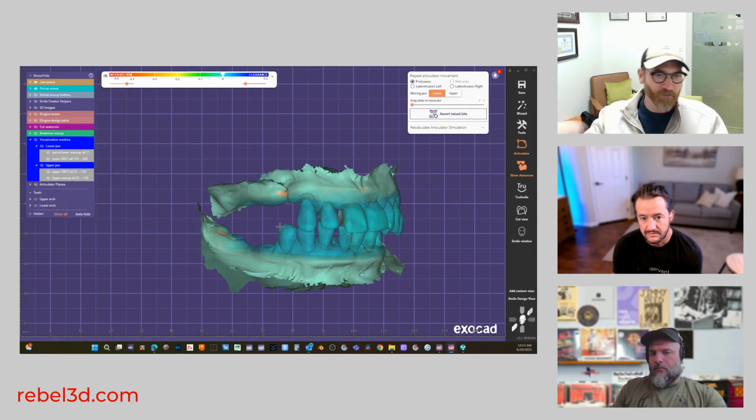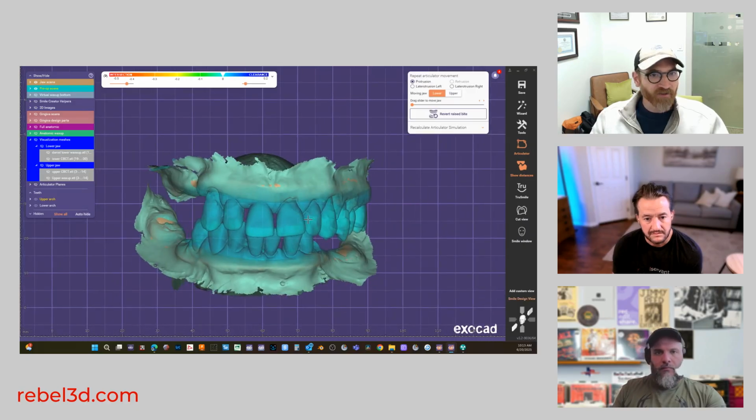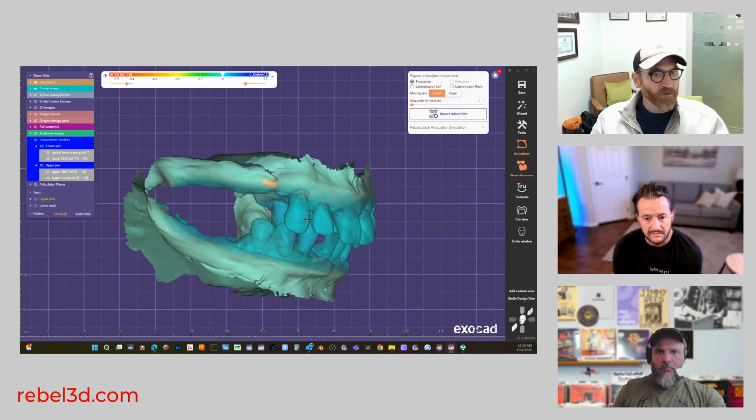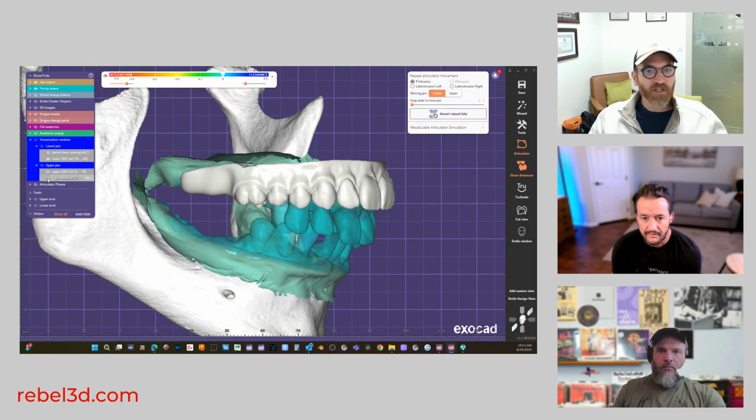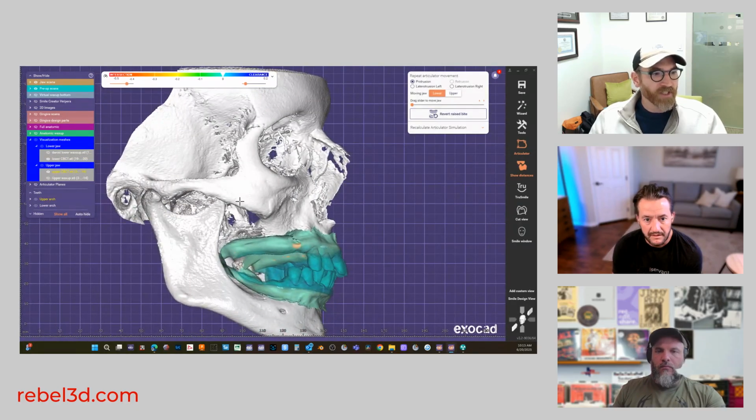You know, how much are we going to reduce the bone and everything. And so I got these scans, right? And now I have to articulate them. And what I'm doing at the very beginning, I'm setting myself up for success here, because the extra data that I'm including here are individually segmented jaws from the cone beam CT.